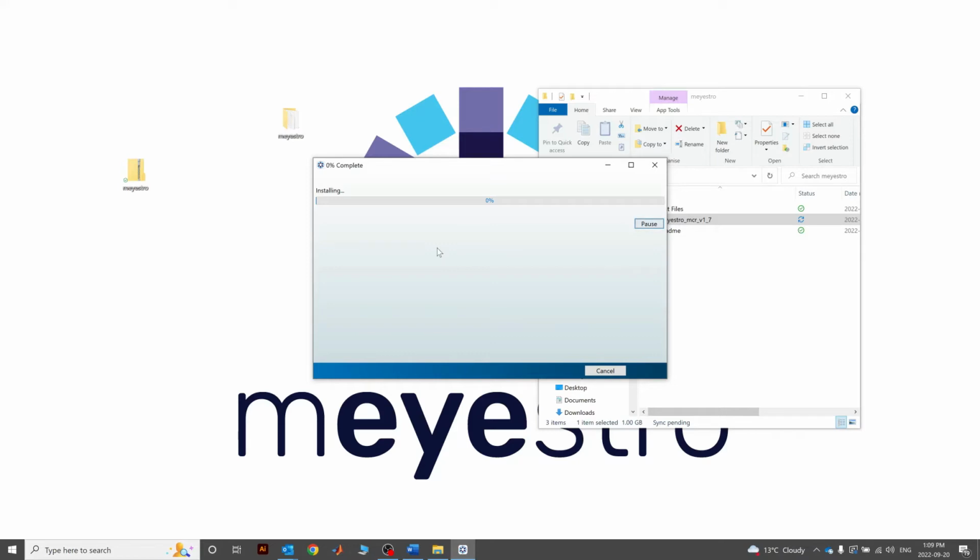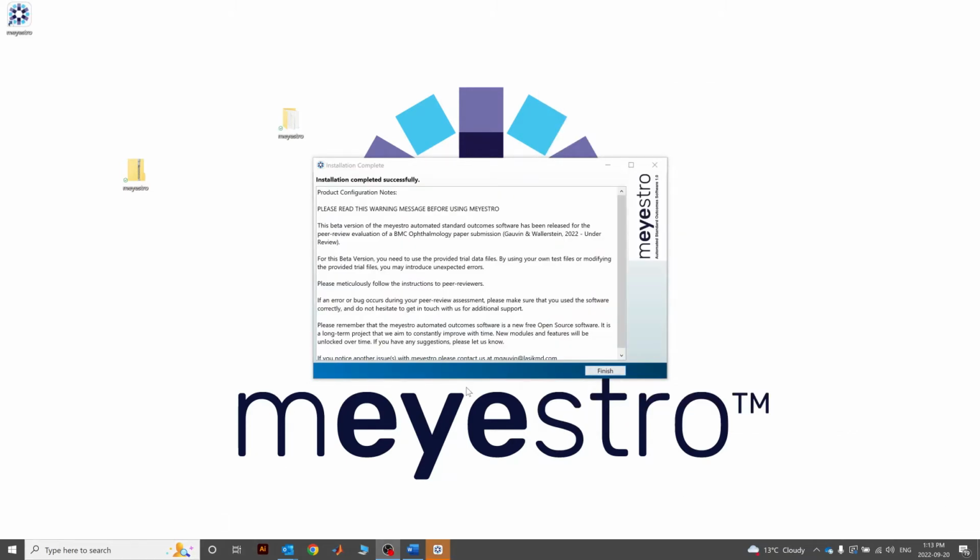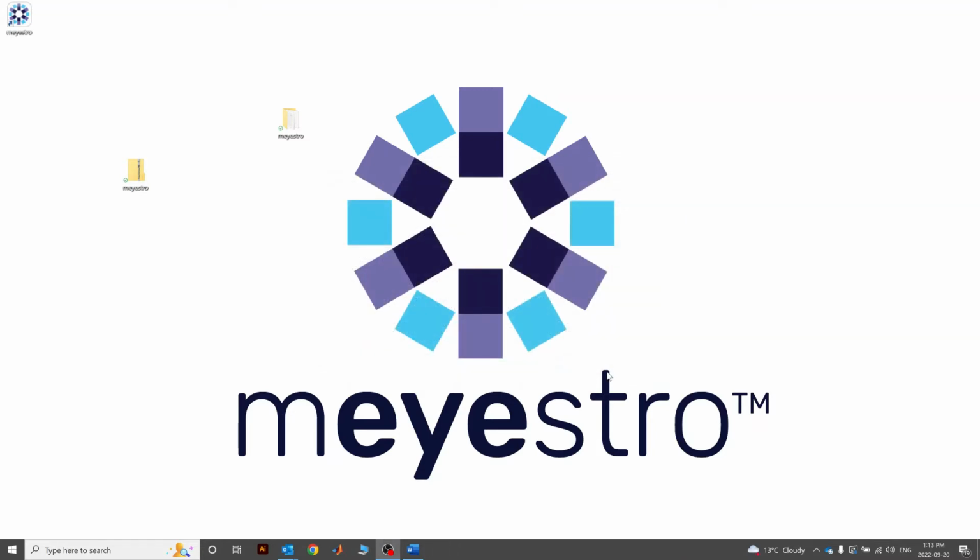I will now let the installation run and come back once done, and depending on your computer speed, this may take a few seconds and up to a few minutes on a slower, older computer. There we go. The installation is completed. Just click on the Finish button, and now you have a mEYEstro icon on your desktop. We are ready to generate the graphs from the 3 trial datasets.